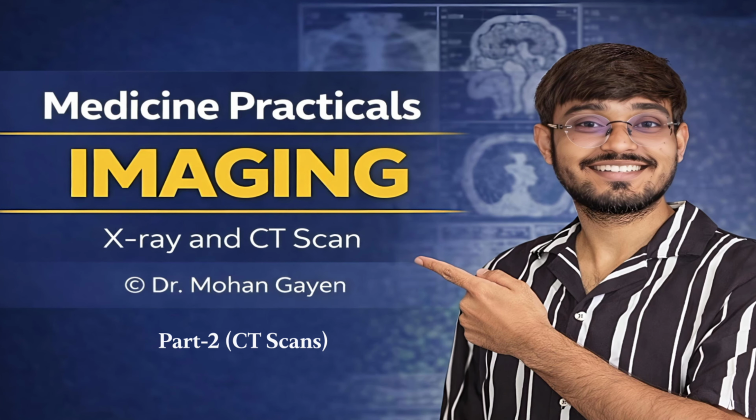We are taking a sequential, systematic journey through medical imaging. Specifically, we're looking at the human brain under duress. And we've got a series of 11 distinct, non-contrast CT demonstrations queued up to do exactly that. Yeah, 11 scans. We're skipping the fluff completely and diving straight into the stark grayscale reality of neurological emergencies.